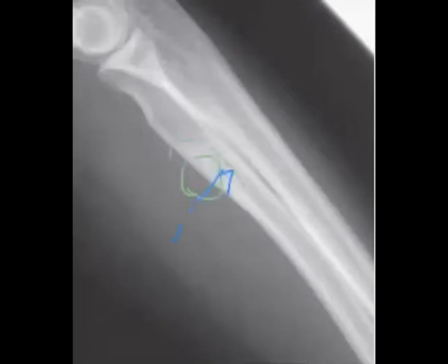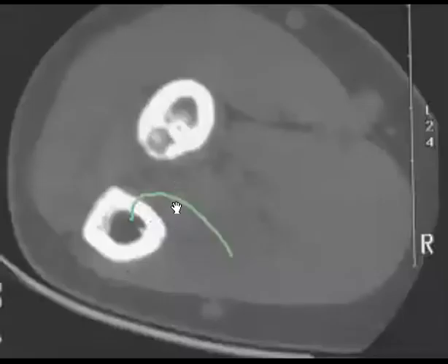If you find it, perfect, nice. I see a lot of drawing with blue. So I agree with you, totally. Now I can show you the CT, and thank you for this drawing. You can see that this is the osteoid osteoma here, and you proved that. That's nice.